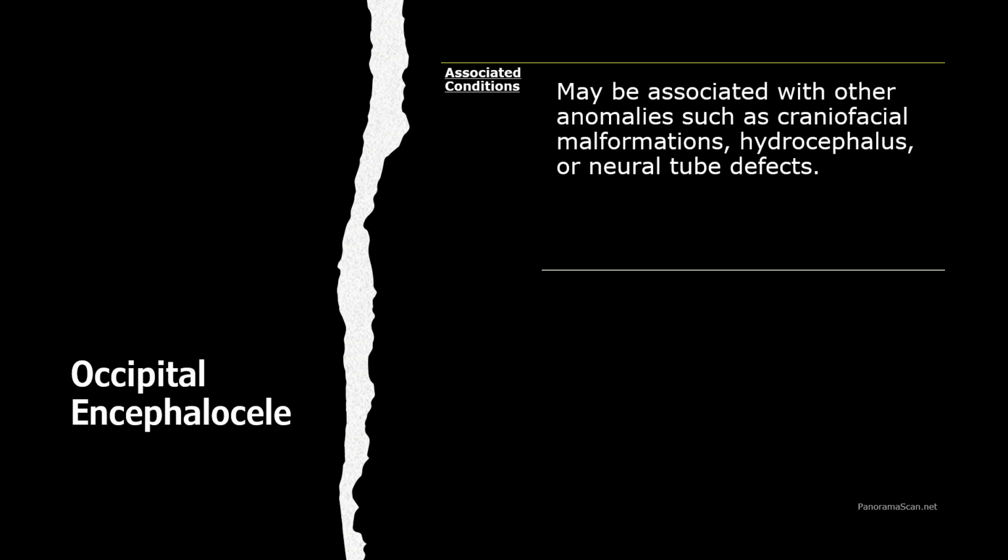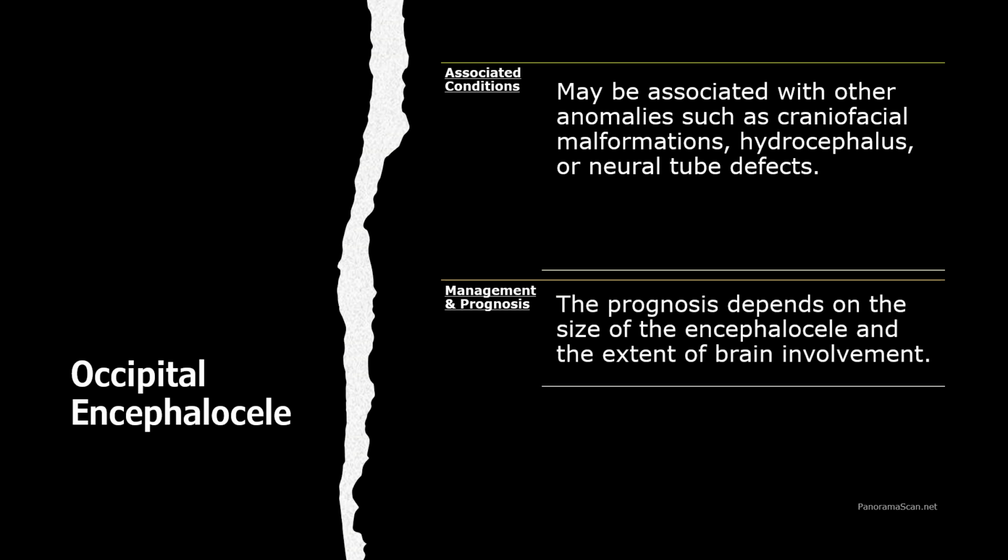Advanced imaging with 3D and 4D ultrasound allows us to detect these concurrent anomalies early, providing a more comprehensive view of the fetal condition and informing a multidisciplinary approach to the care. Let's now discuss management and prognosis for occipital encephalocele.